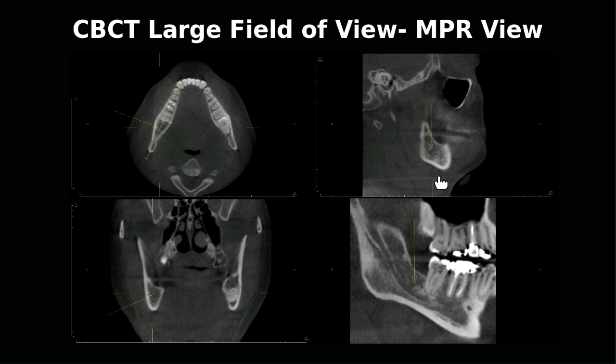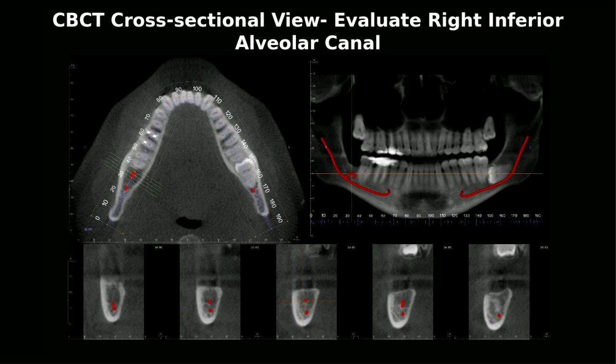While doing that, they were actually injuring that nerve in that area, which they missed in the pan. So pan is very deceiving. Make sure you have a CBCT scan and evaluate everything thoroughly. So I traced the nerve canal. This is the mandibular canal, this is the mental foramen, and right at the number 32 apex area, the canal kind of goes superiorly and loops towards mesially.